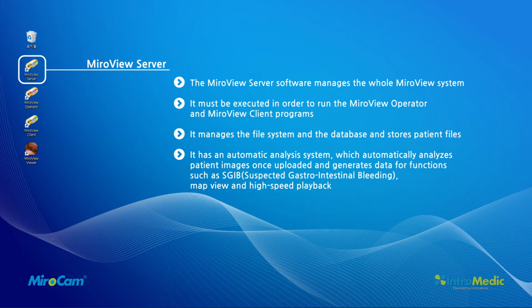It has an automatic analysis system which automatically analyzes patient images once uploaded and generates data for functions such as SGIB, MapView, and high-speed playback. You can view the image analyses on the Task Management menu.